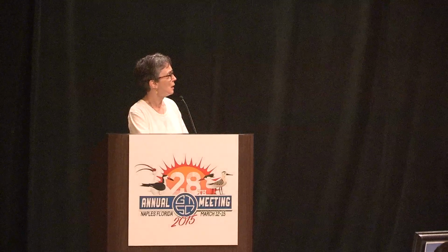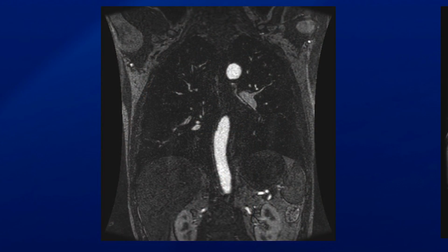And again, because of the lack of radiation exposure, if that's a consideration for you, I would consider MRA. Just ask the radiologist if this is something that it works well for, or if you should get a CT on it. So this is the very bolus contrast. You can see the kidneys are just starting to light up. Here it is. It's a beautiful look.